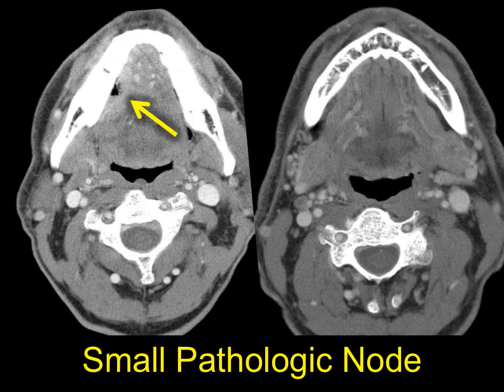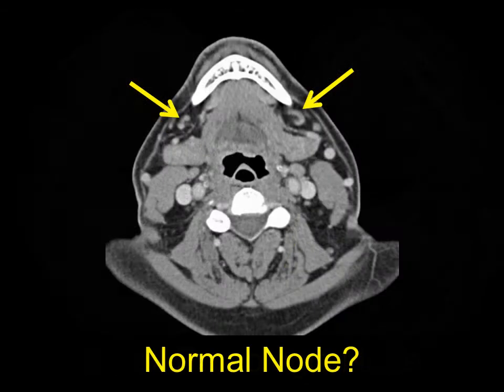Here's a case of a patient who had a lateral tongue ulcerative crater squamous cell carcinoma on this post-contrasted CT image, and we can see on the same side, there was a necrotic lymph node that was initially missed on imaging. And this is where it's important for us to think about those imaging characteristics of those lymph nodes.